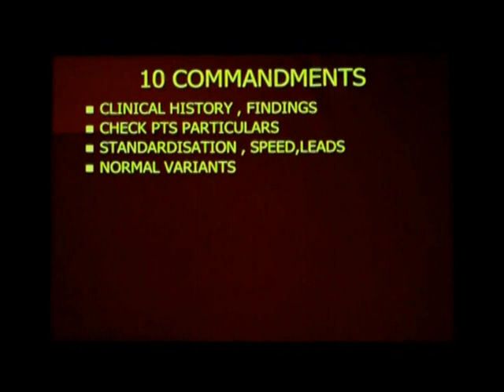You almost have 15 to 18 causes of T wave inversion. So many conditions, even a non-specific change. Even normal people, especially women, can have a T wave change, the T wave inversion. So not all changes are diseases. You can have so many normal variants. You must be aware of what the normal variants are before you attribute a particular change to a disease.